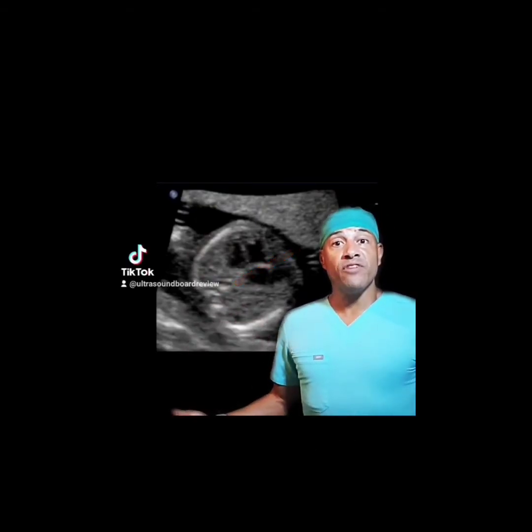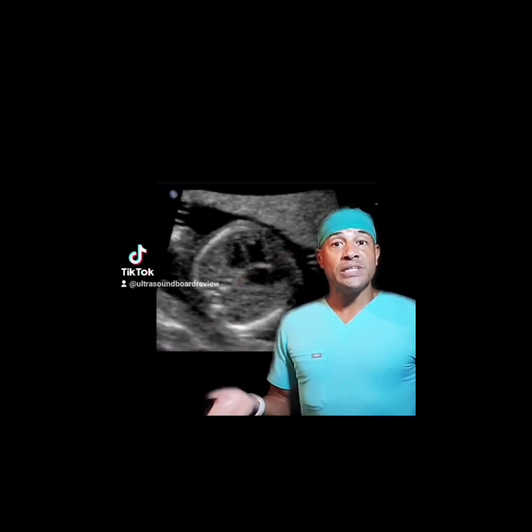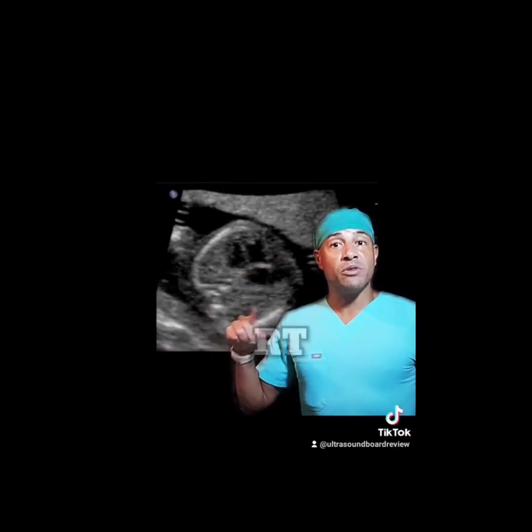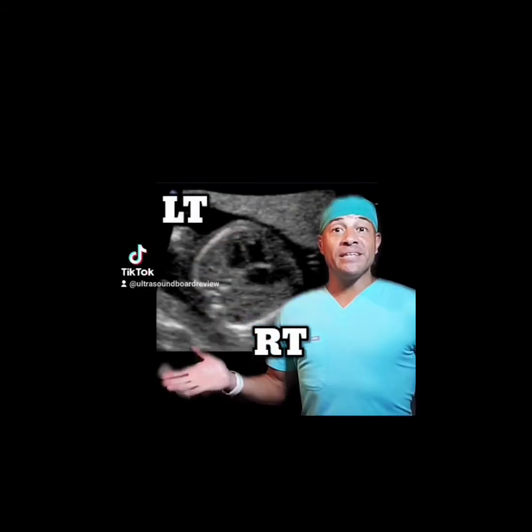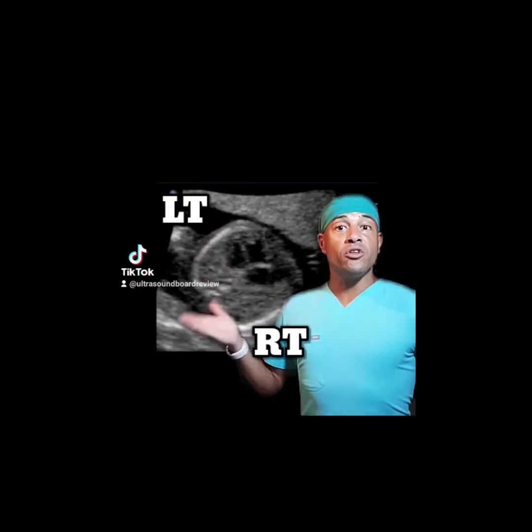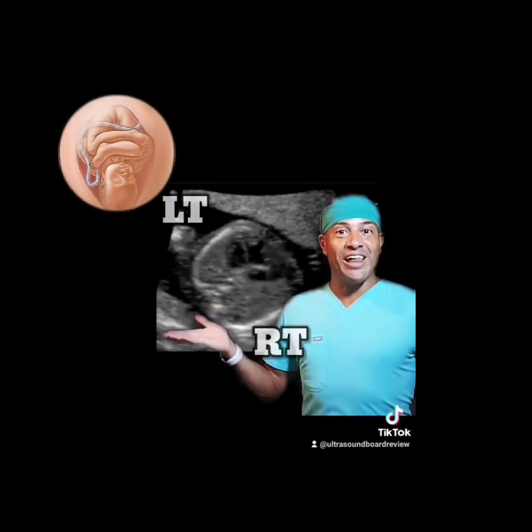Now, how do we determine the fetal presentation? Well, since we decided that this is situs inversus and the stomach was over here, this has to be the right side and this has to be the left side. That being said, if this is the right side and this is the left side and the spine's right here, the only presentation that can be determined here is the cephalic presentation.